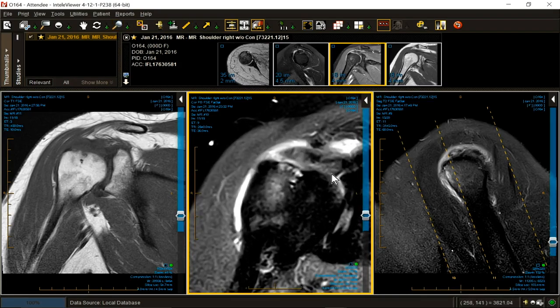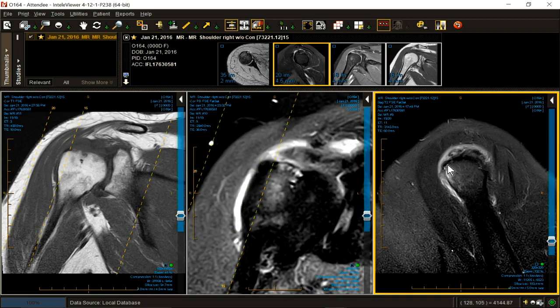There's our sick, tendinopathic, tendon fiber failure, hypertrophic cuff. But right there, defect. That's known as an avulsion tear or a footprint avulsion tear. Now, avulsion doesn't mean bone. It means the tendon is avulsed from the bone. Can we see it sagittally? You bet we can.